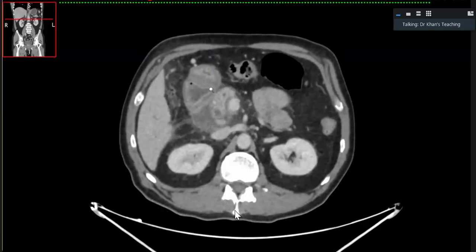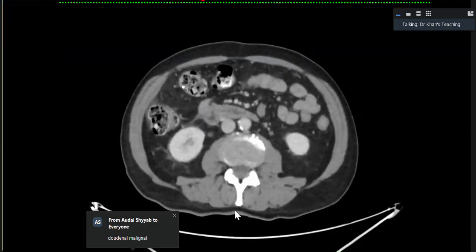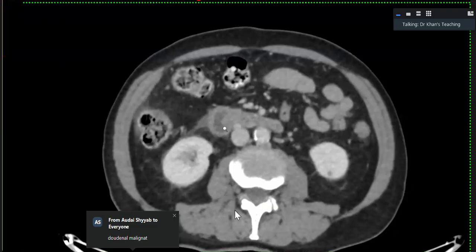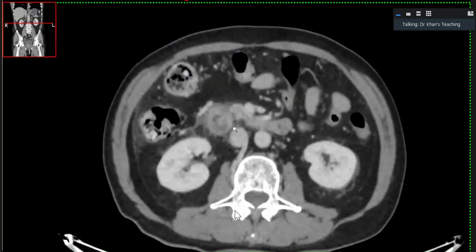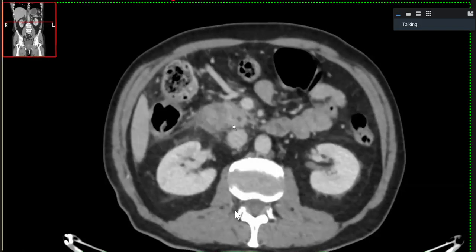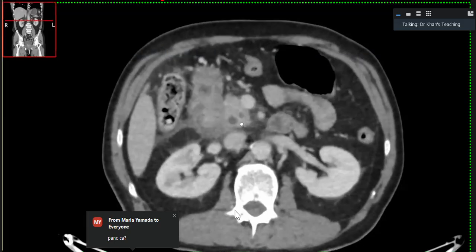Now, why have they done it? If you see the duodenum, let me take you to distal. This is the D3, D2 junction. I am tracing it upwards, coming superiorly, towards the ampulla. And you can see that the lumen is completely infiltrated, gone. There is a mass there. This mass actually is causing obstruction of the CBD.